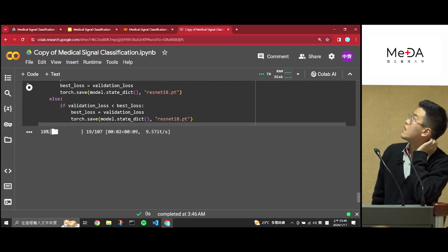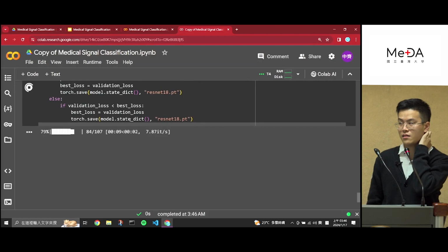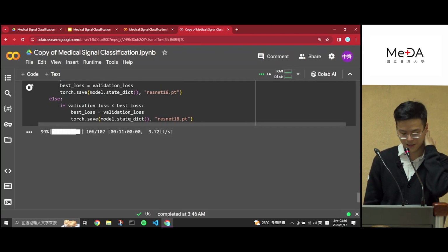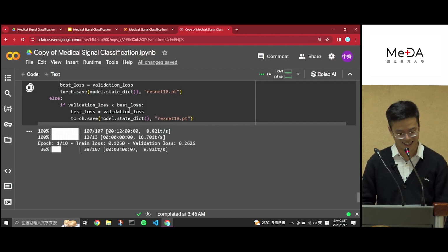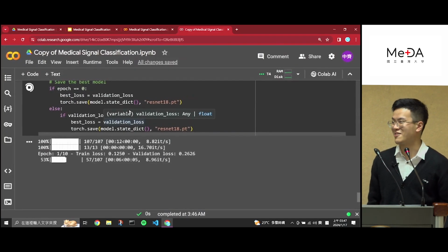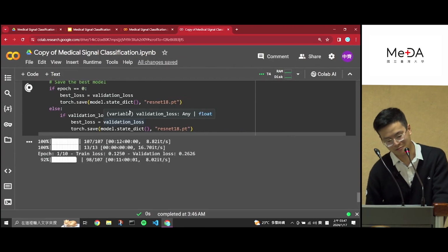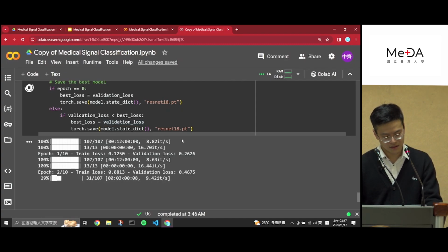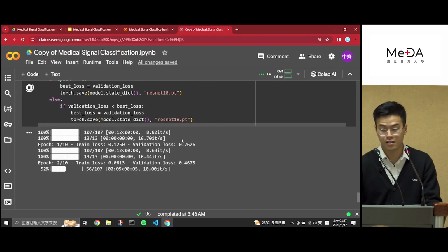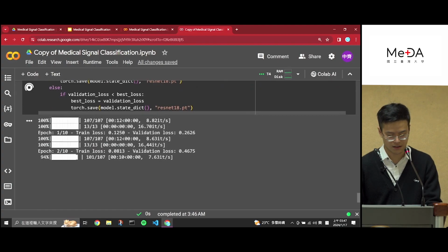Now we have 4 minutes left. Maybe it's now time for Q&A. If you have some questions or things that you want to know about, you can ask now, I guess. Or we are gonna try to look at which combinations of transformations give the best results. Here we're running again, which does not seem better, honestly.